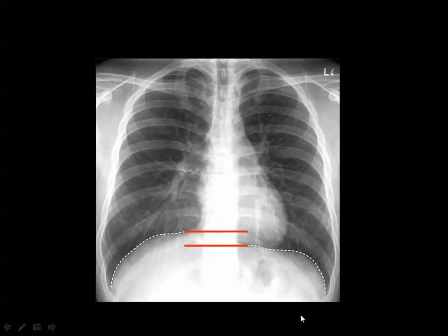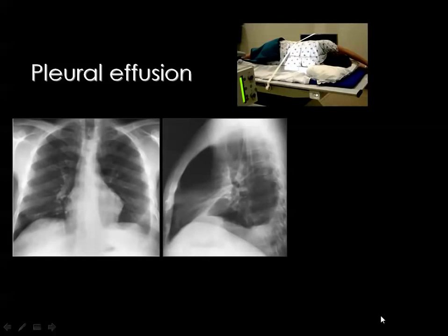While interpreting the chest X-ray, you should know that there is some difference between the level of the diaphragm on both sides, and this indicates that the right cupola is relatively high compared to the left one by a distance ranging from 1 to 3 centimeters.